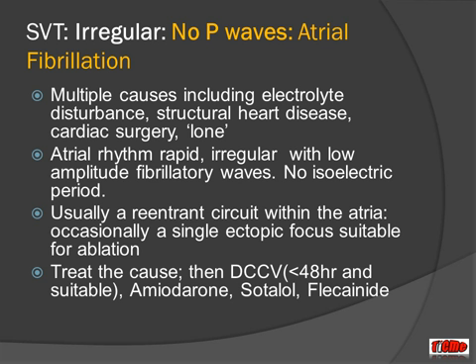This is paroxysmal AF. So atrial fibrillation has no P waves and is irregular. It's caused by multiple things, including electrolyte disturbance, structural heart disease. It's often post-cardiac surgery. In patients who don't have any underlying cause, particularly the younger patients, it's known as lone AF.